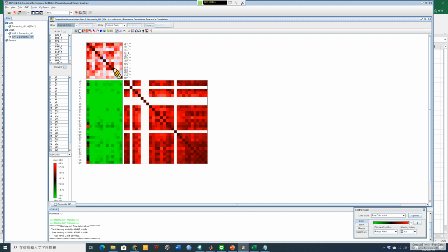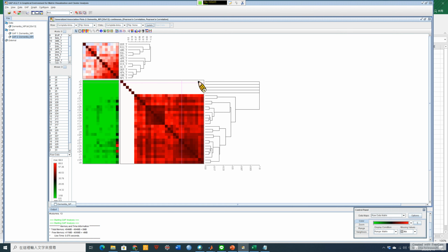And according to this data, you can just classify this data into its original orders. So there's no clustering here. It just shows the original order of the data. You can also see this in this tab, original orders. So we can do some clustering analysis here. Just click on this drop-down box, then click on complete linkage, and also this complete linkage, then click on update.